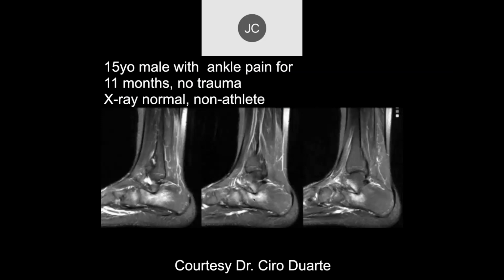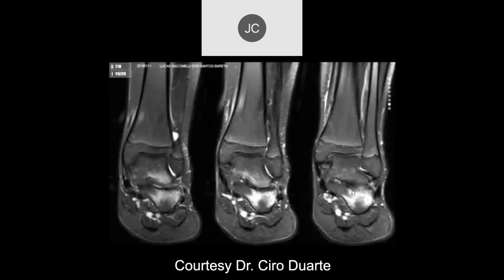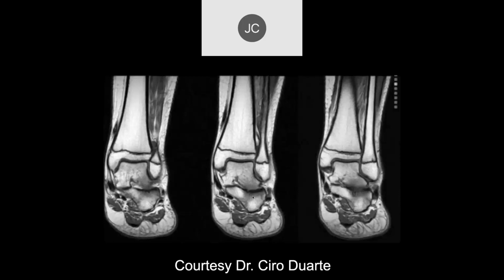We're not quite in the right plane, but there's a suspicion that you might have a pes planus in this particular case, but we can see this large facet here, all this eburnation and edema in the area of the angle of Gissane, marked bony edema here, and all through and here with the degenerative disease.